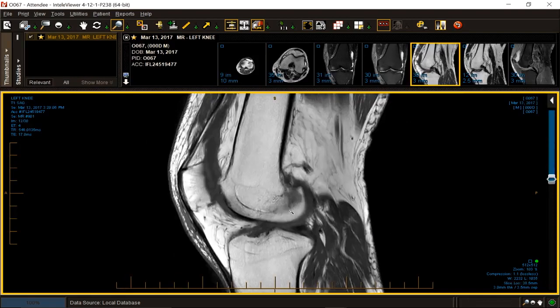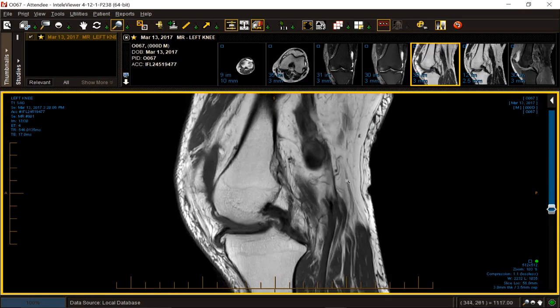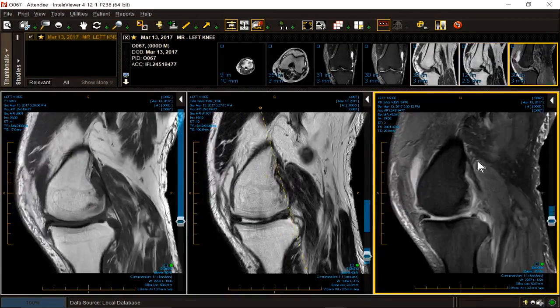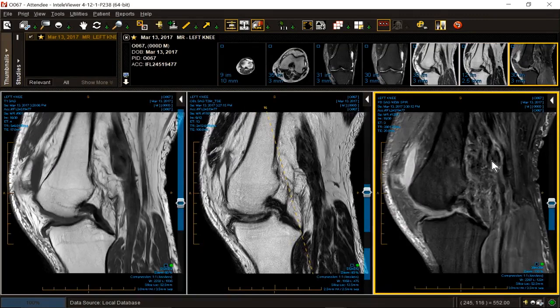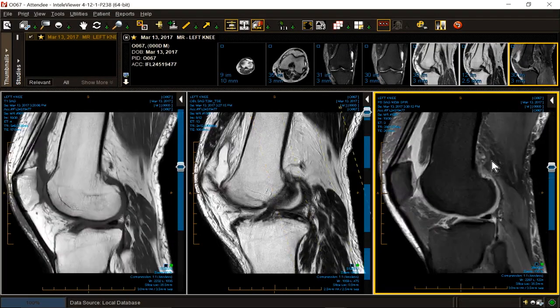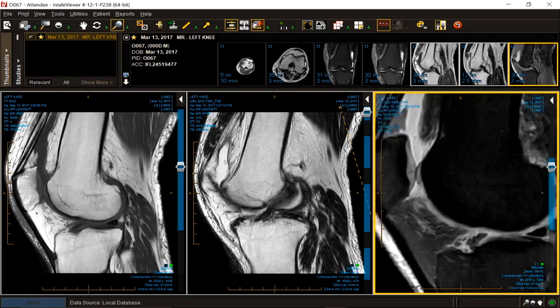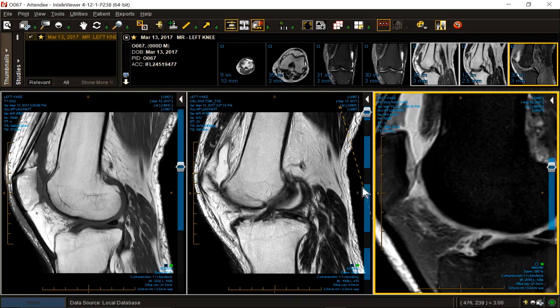Better look at the popliteal fossa. There she blows. Let's put them up. That's part of your search pattern. There's your aneurysm. So I will give you the patellofemoral disease, and as mentioned, I enjoy looking at the trochlea in the sagittal projection. I get as much or more satisfaction and accuracy from this view as the axial view.